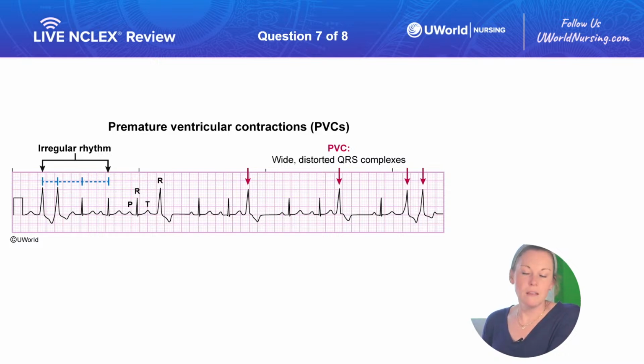And then some of that irregular rhythm is going to swallow up that P wave again into the QRS. So we're going to be out of sync, and we're going to have a jolt of energy happening in our ventricle.